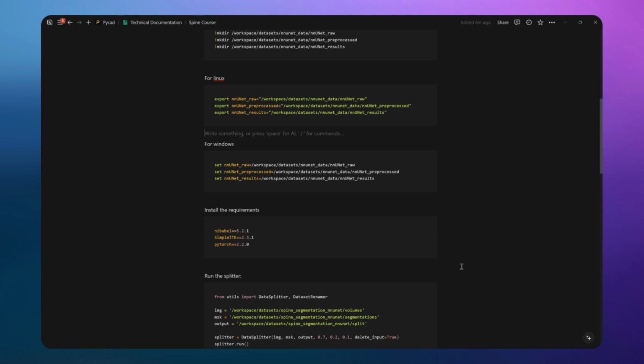For the dataset that we'll use here, I have already corrected this, but the script to do this, I have written and included in the repository, so you can find it and use it. If you are using a different dataset, then I recommend you pass it by the script so that you can correct the metadata before going to nnunet. Because if nnunet finds only one case in your whole dataset that has this issue, the whole process will stop until you correct or you delete these cases. So to avoid any issues, you can run it at the beginning as a verification step.